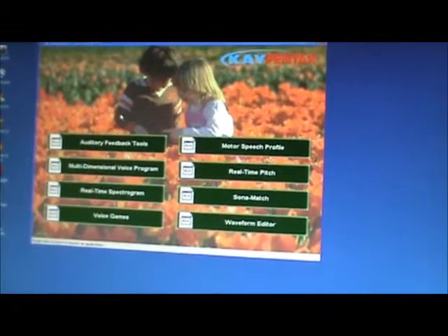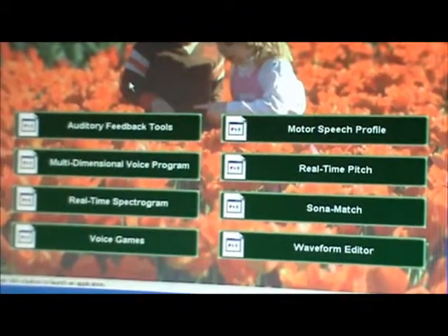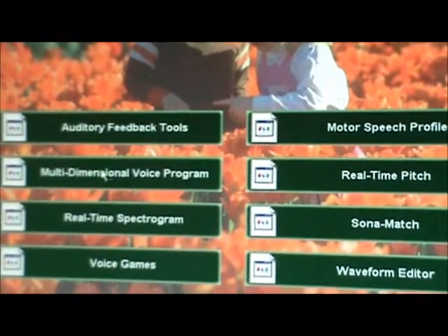And to get the regular quality measurements, you go to multidimensional voice program. So we're just going to click on that, and then this will open. Now here's the first piece of advice. You'll see all these little open windows down here, and if anything goes wrong, you're thinking, oh, maybe I need to close those windows. Never close those windows.